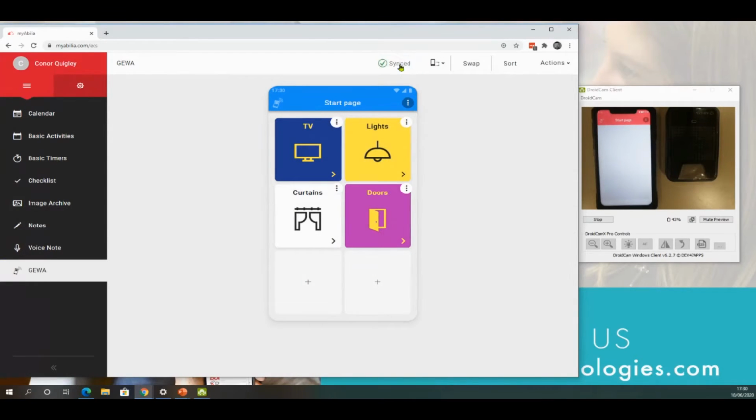When I click the sync button, as you can see on the right hand side, it automatically synced over onto my device. So us as a company, SafeCare, we can remotely support our clients. If you're working on assistive technology, or if you're a therapist that supports, so you work in a center, you're an organization, you can now remotely access a person's device. If they've linked you as a support worker, you can make those edits, you can make those changes and link them back up.